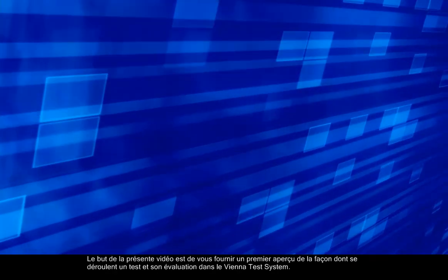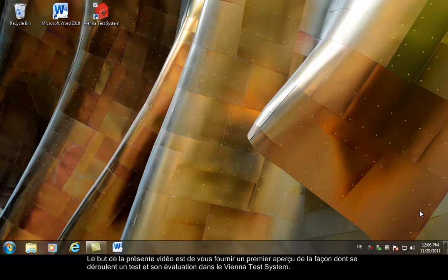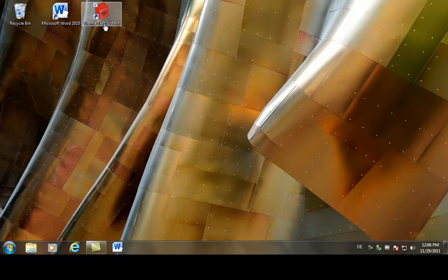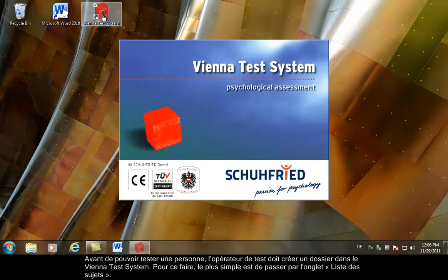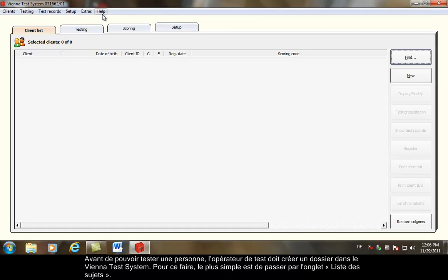In this video we want to show you briefly how tests are administered and scored using the Vienna Test System. Before someone can be tested, the test administrator must create a record of them in the Vienna Test System. The easiest way to do this is on the client list index card.